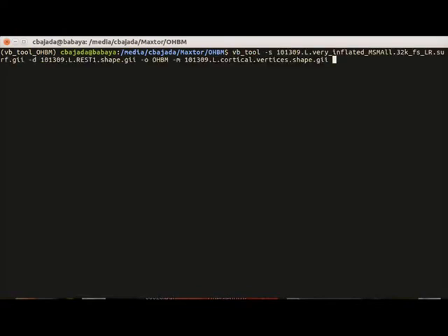So that's using the searchlight. Now let's see what we're going to do if we want to run the cluster. For the clustered analysis, we remove the M file, right? And we create the clustered file. So that is the multimodal parcellation.